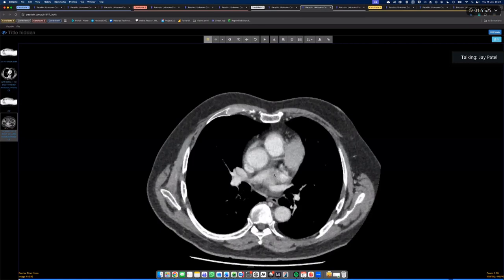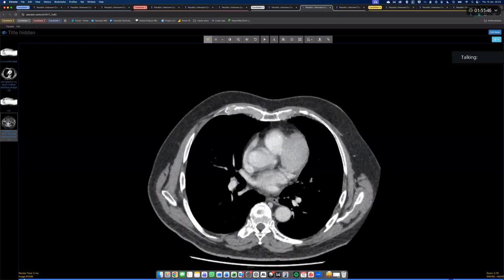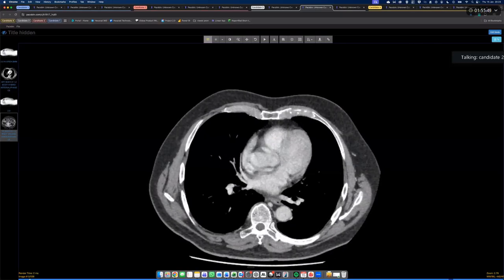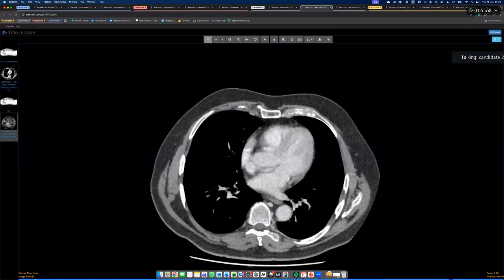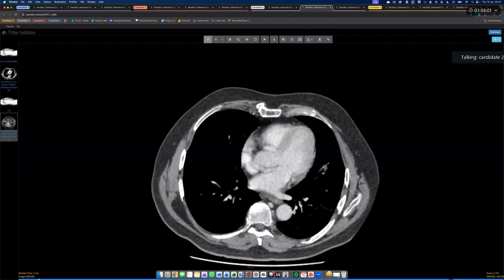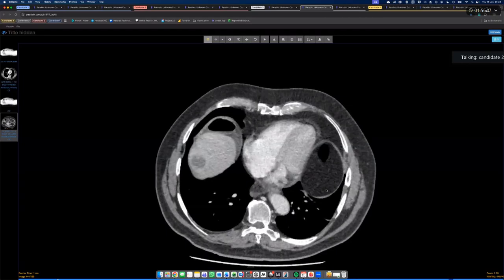This is a patient who presented to accident and emergency with abdominal pain, query cause. I'm sorry, I missed the history part because of scrolling. So the patient has presented in emergency with abdominal pain. I've been presented with a CT abdomen in portovenous phase. I'll take a moment to scroll through the images and then start presenting my findings.